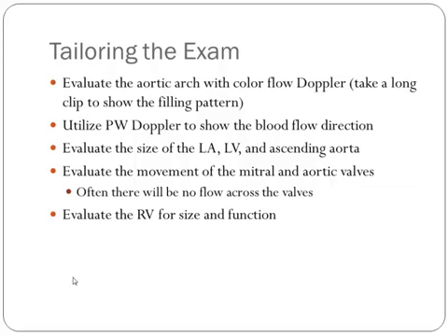So a real assessment of right ventricular systolic function is going to be important in these babies. And if you notice this set of findings with poor right ventricular function, that's just even more reason for urgency, and you want to make sure that that finding is communicated to the pediatric cardiologist immediately.